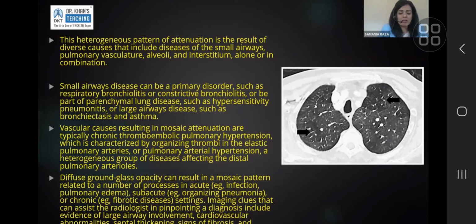There's a lot of literature if you want to read about very conservative ways of reading and assessing whether the black is too black, and then looking at the darker part of the lung and looking at the vessel size, and then comparing the small vessel size in the black or hypoattenuating lung compared to the hyperattenuating lung, and then figuring out if the vessels are smaller.